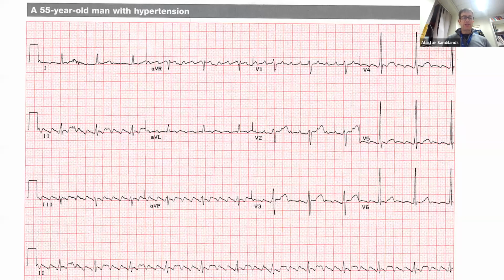Okay, so in this example, what I've done is just tried to show you again about atrial flutter, but slowed it down so you can try and make more appreciation of the flutter waves. Okay, so it's not a tachycardia because our QRS is not going fast. It's now 75 beats. 4 squares, 300 divided by 4 is 75. But now, in V1, these probably look discrete. You probably might say they're discrete. But now look at the inferior leads, and where it's slowing down, it's definitely now continuous.